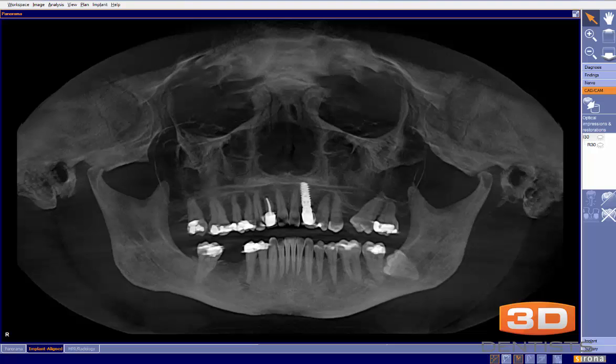My concerns are the bone on the buccal and the path of the nerve. I mapped the nerve, but it isn't totally clear. Regarding the bone, would you graft at placement, or is this not a good guided case? So we'll take a closer look at this.